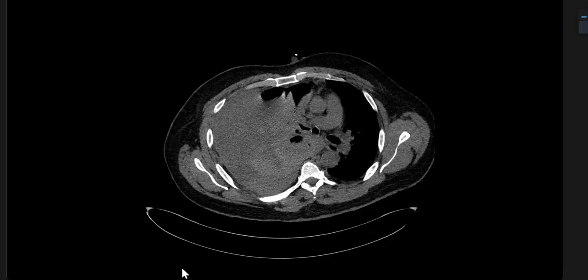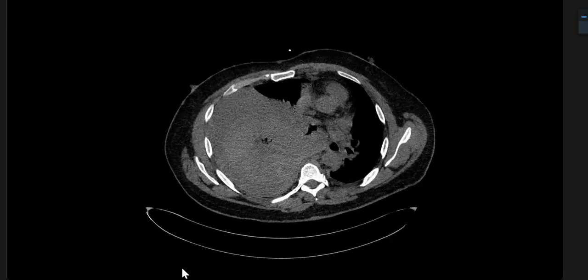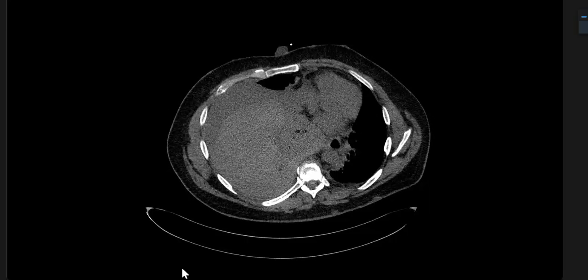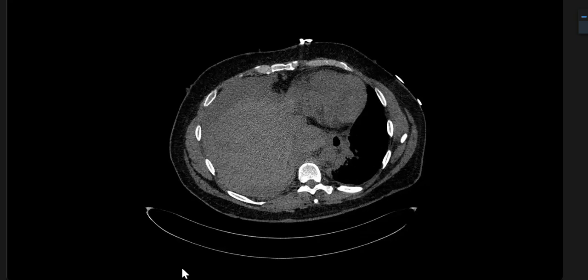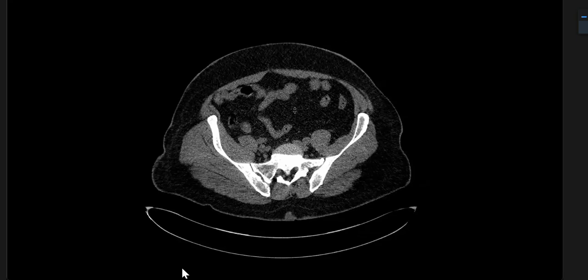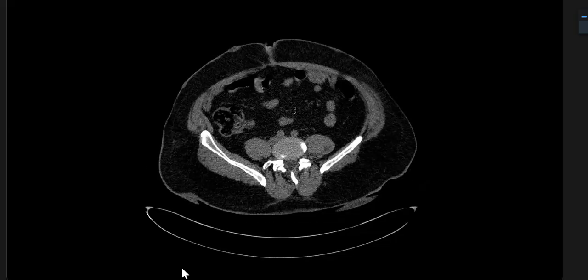And let me take a few moments to go through it. How many seconds it took? 2 seconds, 3 seconds. Then you just keep scrolling. And yeah, you were right to scroll down. I said, no, stop it. Just focus on thorax. Okay, you come back.